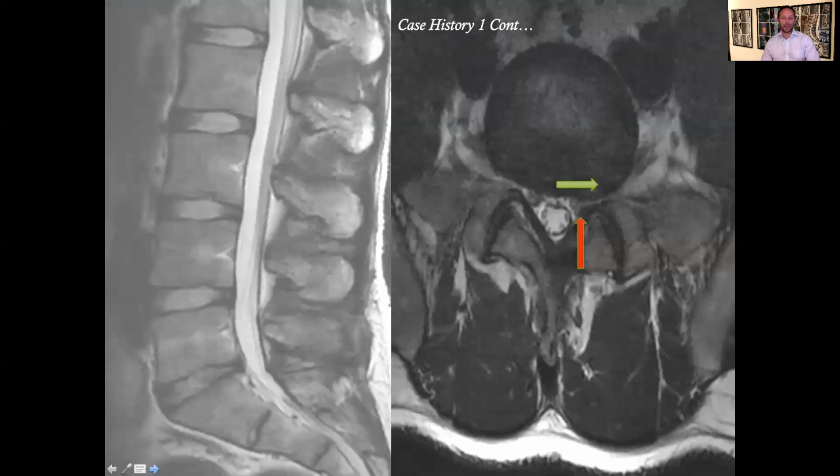So here is that MRI scan. Now on the left-hand side here, it looks pretty unremarkable. There's some narrowing of the L5 disc at the back, but that doesn't necessarily mean it's a pain source. You could say that there is a marginal posterior retrospondylolisthesis of the L5 on S1, mild as there's a slight overhang. But again, is it relevant? Maybe, maybe not. But what we're more interested in is this picture here.